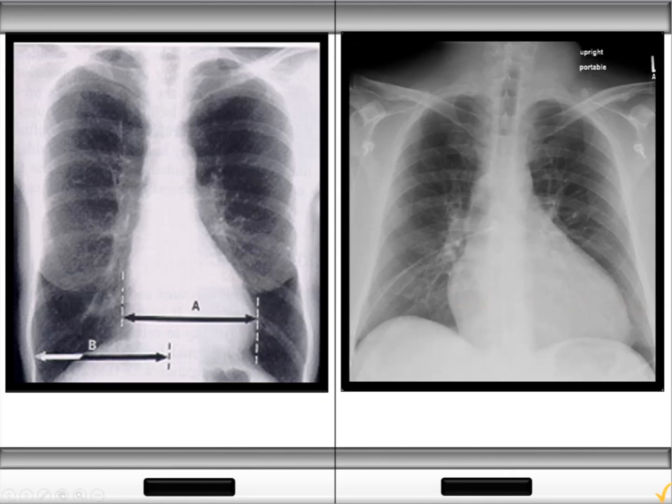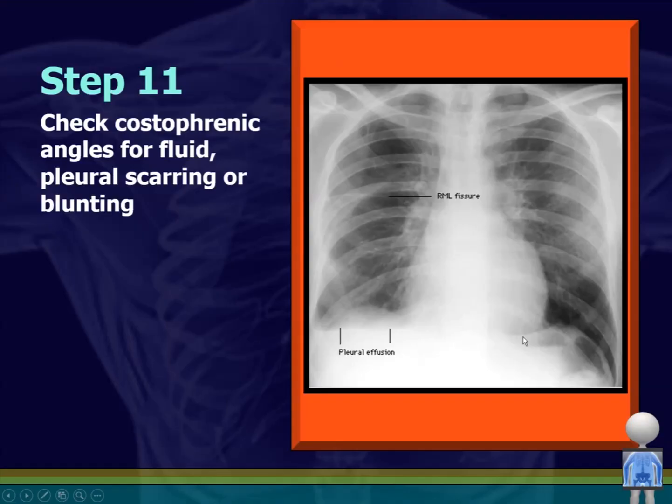You may see calcified valves. You may see mechanical heart valves. You'll definitely see those, correct? And like I said before, you may see enlargement of other structures. So this person has cardiomegaly. They do have a little bit of right atrial enlargement. You see that bowing that's out here. And they probably have a little right ventricular enlargement as well.